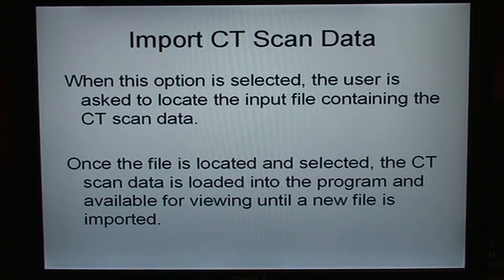When selecting the Import CT Scan Data function, the user is asked to locate the input file containing the CT scan data. Once the file is located and selected, the CT scan data is loaded into the program and available for viewing until a new file is imported.